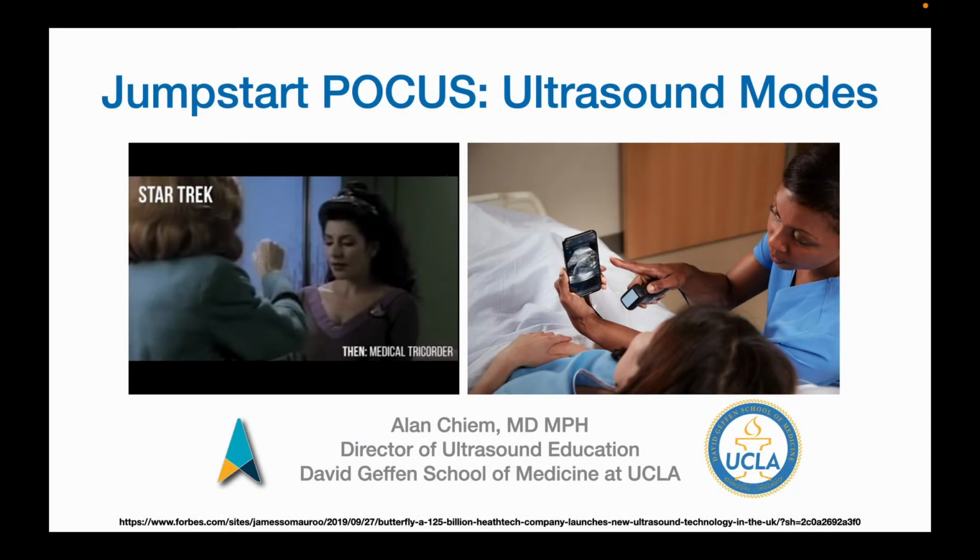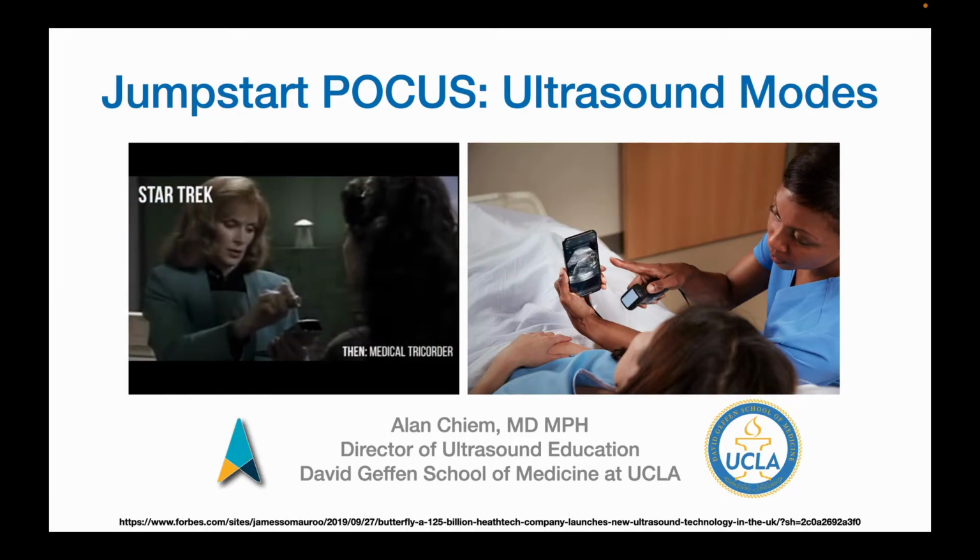Hi, welcome to this second part in the Jumpstart POCUS series on ultrasound modes. While being able to see real-life dynamic anatomy in POCUS is becoming necessary in 21st century medicine, the additional modes really bring a whole new level of functionality. Not as cool as a tricorder, but amazing nonetheless.